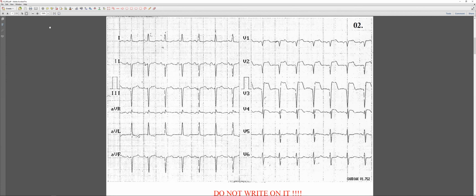Okay, good. And we will go to the precordial leads. I will see V1, V2, and V3, and I can see that the transition zone is a bit shifted to the left. I assume this is also because of the axis change. I will look at V4, and because it's left deviation, I would say it's anterior hemiblock.